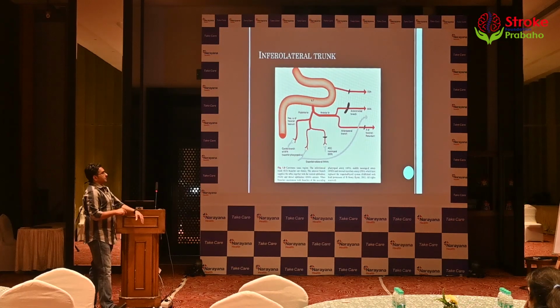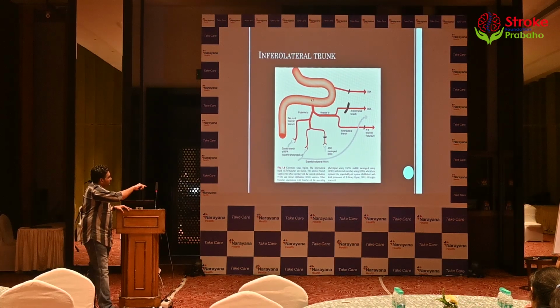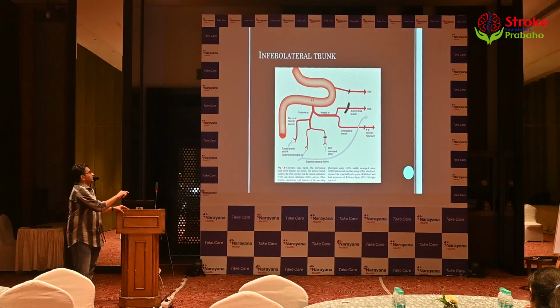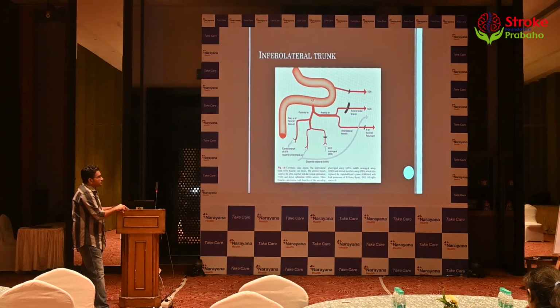The branches of the ILT, again, this is very important when you're dealing with EC-IC anastomosis. We can see this gray line completely supplied by the middle meningeal, which is your ECA system. And we have the red lines, which are all the ICA system. Across them, the anastomosis takes place across foramina. So we finish with the ophthalmic and we think, okay, fine, this patient has a properly placed ophthalmic, and we take that out of the equation, and there is no persistent dorsal ophthalmic.